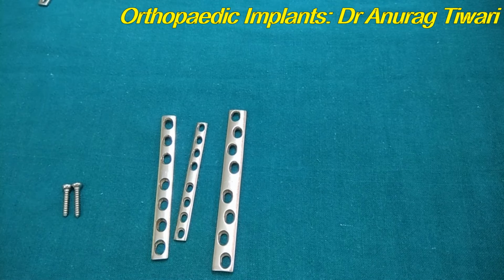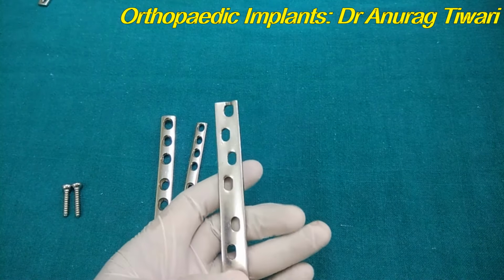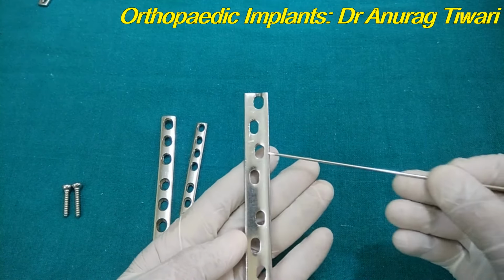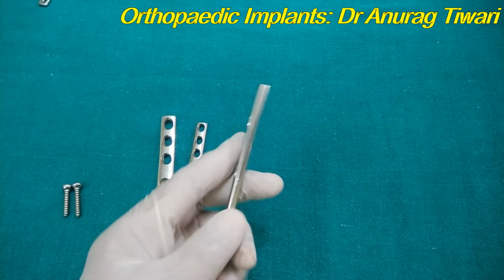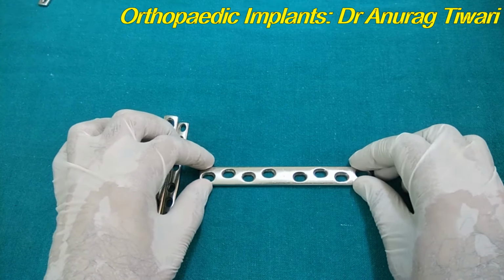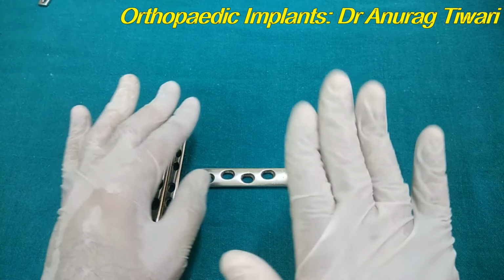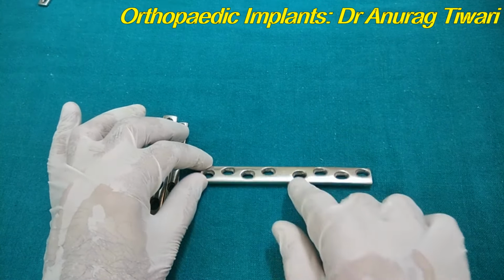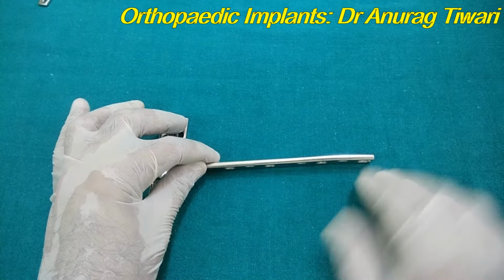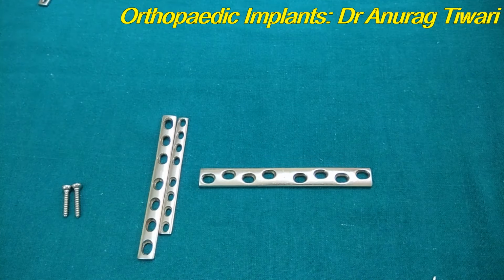Now what is the disadvantage of this DCP? If you see the undersurface of the DCP, it is all flat. So when the plate gets fit over the bone, the periosteum gets devascularized because of the compression. Because the undersurface of the plate and the bone have the periosteum in between, it gets compressed, and the periosteum is mainly the vascular supply of the bone. So it devascularizes the bone.